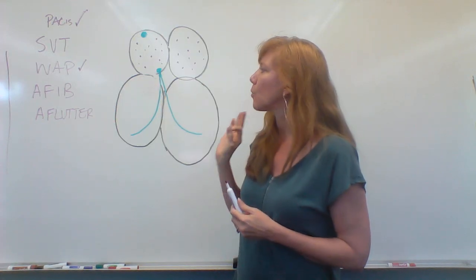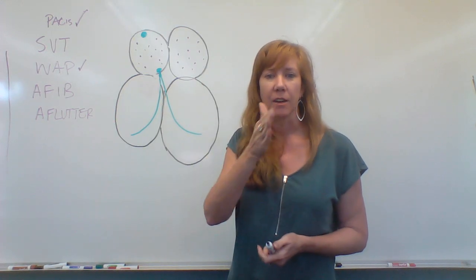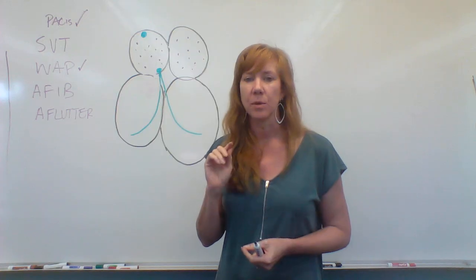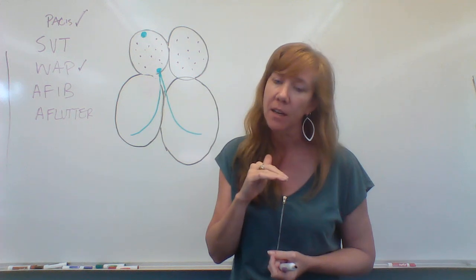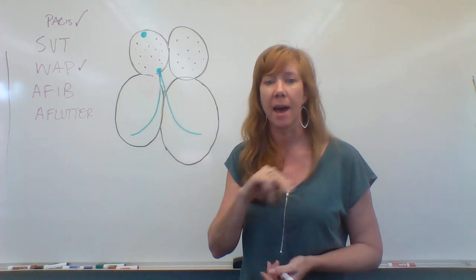The way you're going to recognize atrial fib is the spacing of the QRSs is random. It's irregularly irregular. And the reason that we say that weird thing is because later when we do heart blocks, it's irregular, but sometimes in a repeating pattern.